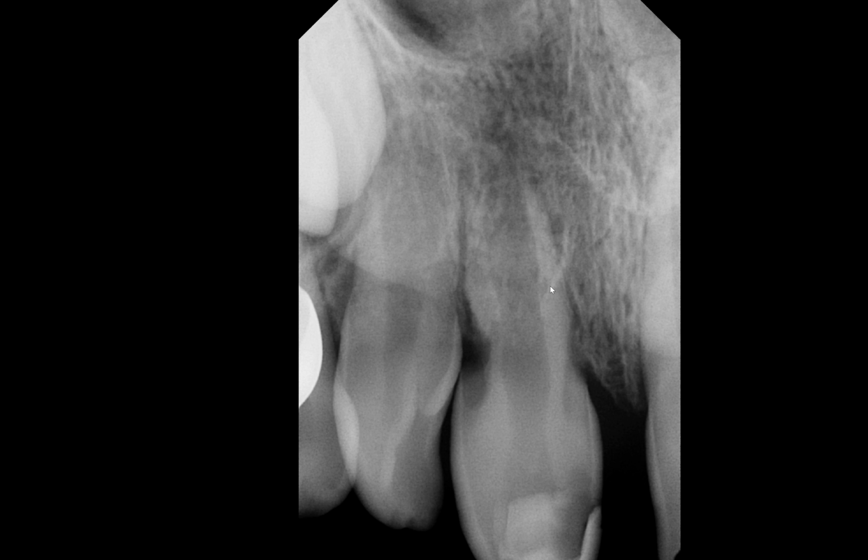Still, I don't see any evidence of further root development or dentinal development. It's still very narrow, and there's a possibility that not only is this dentin very thin, but perhaps there's a communication or a perforation into the pulpal space. Again, that can only be verified with cone beam CT, but I do see a sign of radiolucency that is potentially connecting into the pulpal space.